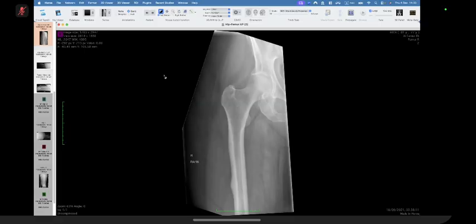This is actually an Aunt Minnie of a case. This is a type of insufficiency fracture, but it's the type where the bone density is normal. And I tried to give you a hint. I said a 77-year-old female, a female. This is a bisphosphonate fracture. And the imaging appearances are fairly typical.